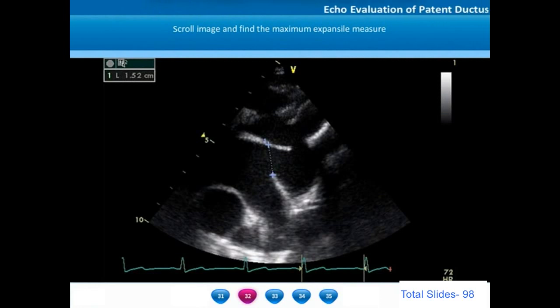The ECG that has been shown below shows the point of the echocardiographic frame, which is almost falling on the T wave corresponding to the end of systole.